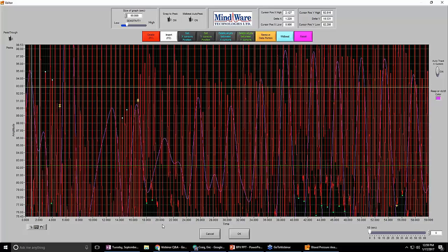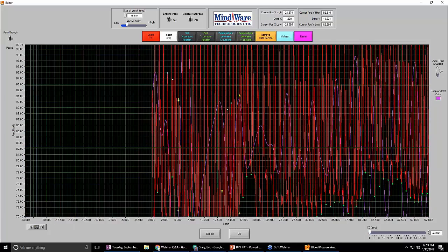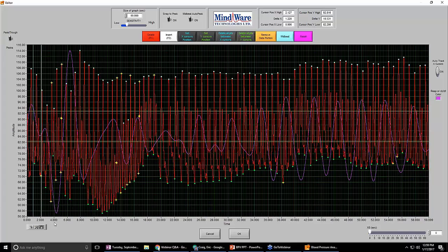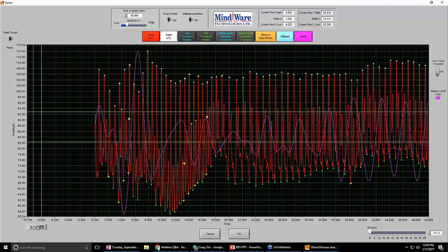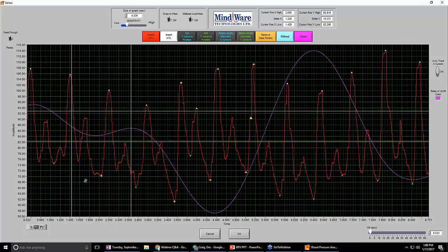We also have this other one, which will let you do the same thing in the opposite direction. I don't feel this is as useful for this application, as we can see our peaks and troughs, but you could find some use in it. We also have these 2 zooming functions here, which is simply a point and click, and it'll zoom into that spot or zoom in and out of that spot. Finally, we have the hand tool, so this will let you move through the data freely as you please. And so let's go back to normal. Okay, so I'm going to go ahead and zoom in here, and we'll start looking at these data.